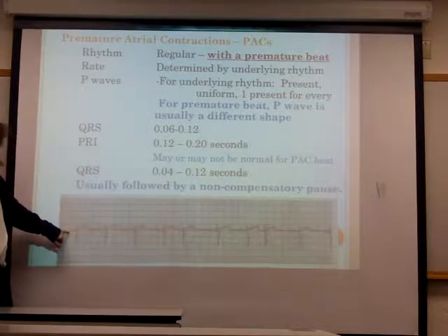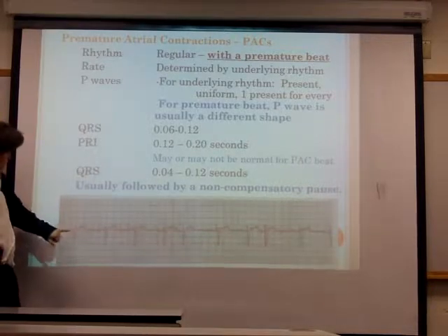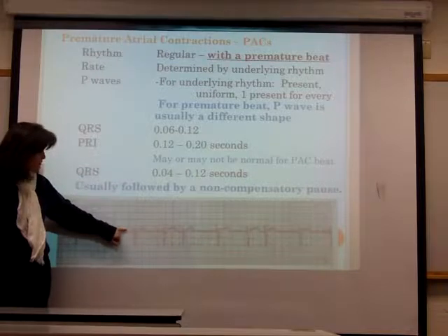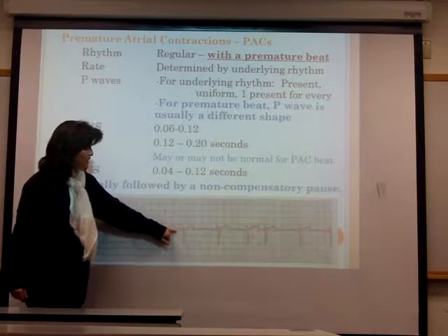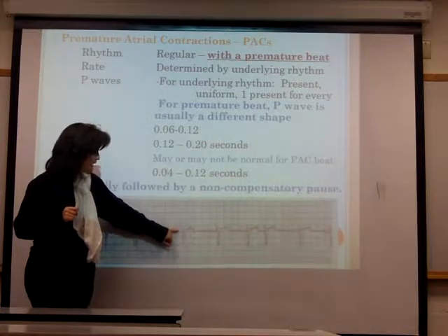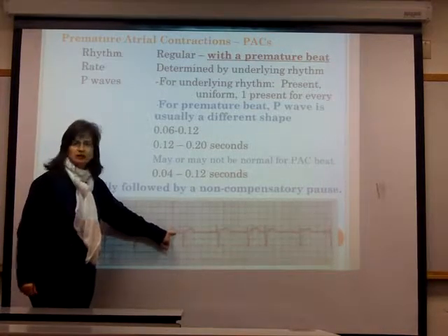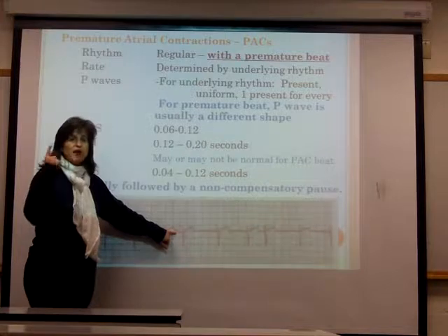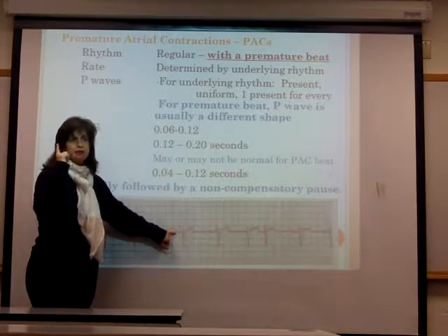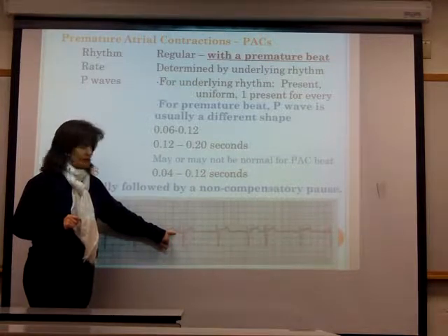The other thing I'm going to do is go to my P wave. I see a P wave here, here. It's upright, it's not peaked, looks very normal. Here, here. And then when I get to this early beat, because I know it's early, I know there's a problem, I've circled it, I notice there's a P wave and it's clearly upright. So I've got an early beat that has a P wave that's upright. So in my head I'm thinking, I'm probably dealing with a premature atrial contraction.